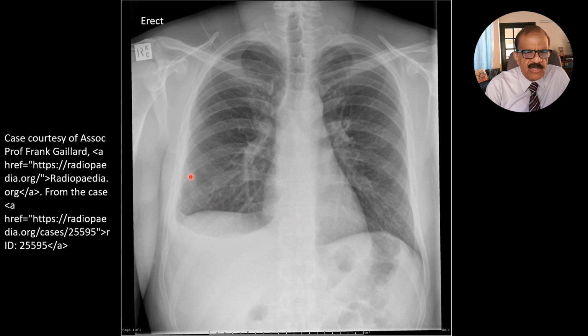Yes. This side, I think there is fluid, but you see it has sort of risen this way. If you compare this wall, see this one, there's a fluid which is rising up. The patient is erect, it's not a decubitus view. So in upright position, in a normal person, fluid should have taken this side, this shape. But in this case, there is definite obliteration of right costophrenic angle, and you can see this lamella of effusion going up. So this is lamellar pleural effusion.